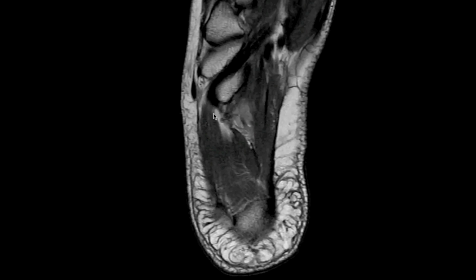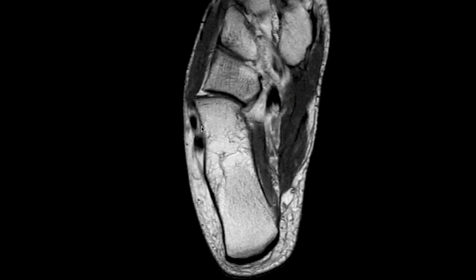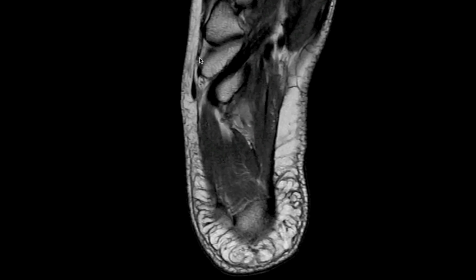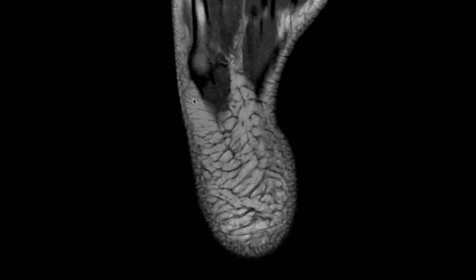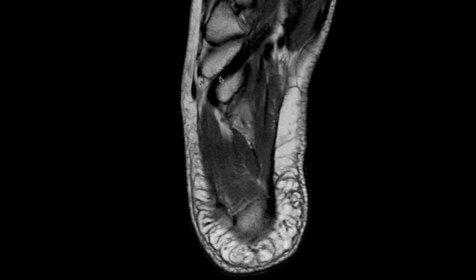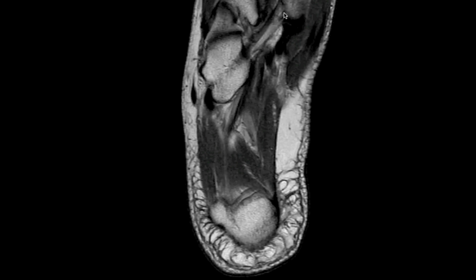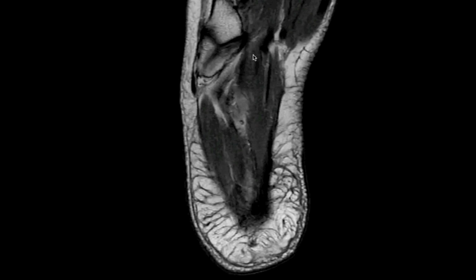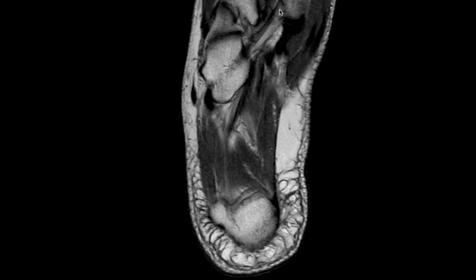Now, along the far plantar aspect, when we follow our peroneal tendons distally, we talked about the peroneus brevis inserting into the base of the fifth metatarsal. But what happens is that the peroneus longus will make a turn deep to the cuboid and it will insert into the lateral base of the first metatarsal. Where it travels along the plantar aspect of the cuboid, this is known as the cuboid tunnel. So we nicely see the attachment of the peroneus longus into the lateral base of that first metatarsal.